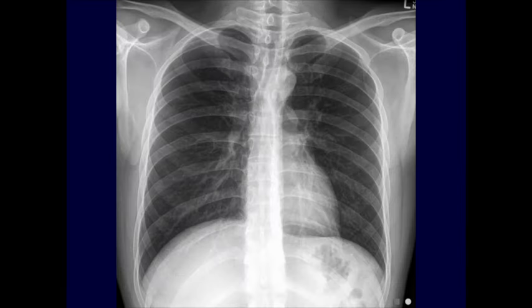So back to our chest x-ray. We mentioned that x-ray beams that make it through the patient can be detected on the other side, and those that don't make it through obviously cannot. On an x-ray, areas that don't attenuate the x-rays as much, i.e. the x-rays that make it through easily, show up as darker. This means that, in general, less dense things look darker, like the lungs, and more dense things look brighter.